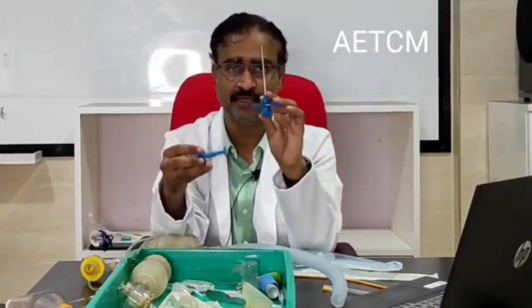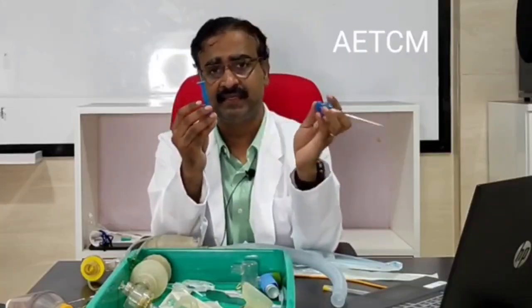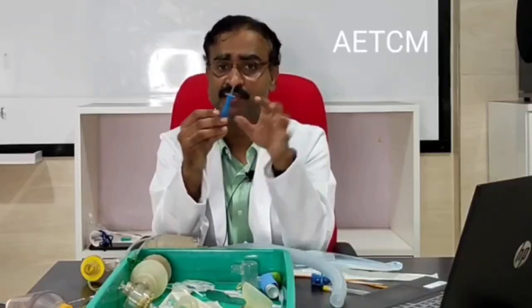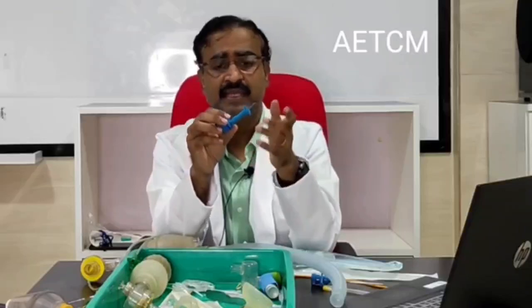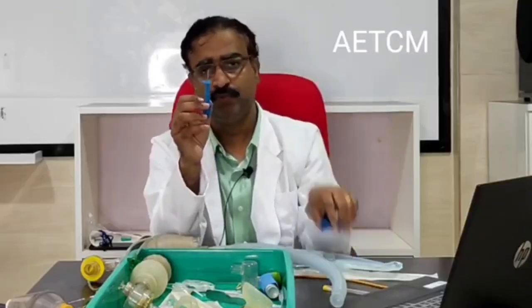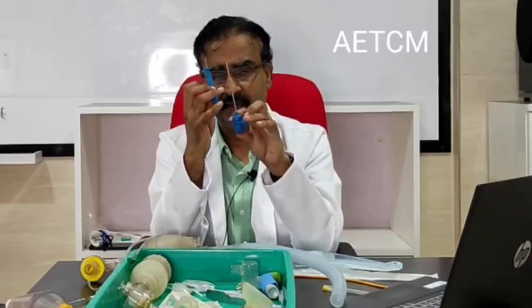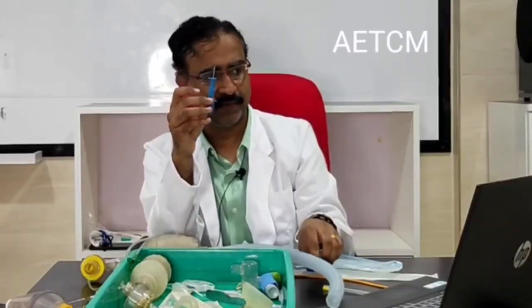So this needle is used for older children, adolescents, and this other needle is used in smaller infants and babies. You have a guard, so you don't penetrate too deeply and go across the marrow. That should not happen. So that is the basic difference between the two needles that you have, for the adolescent and for a small child or a baby, right.